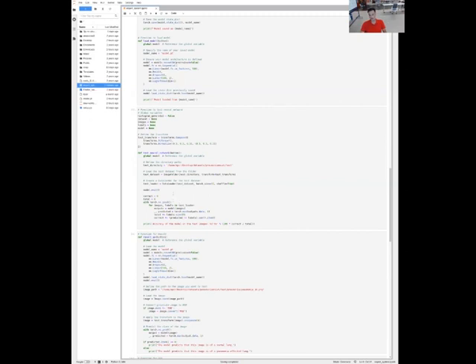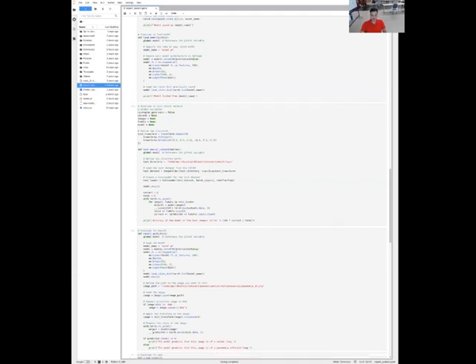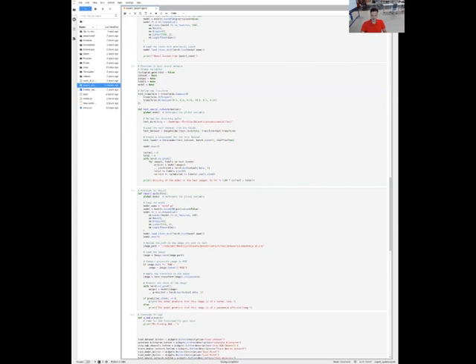Is it 100% accurate, or 90% or 80% or less than that? The percentage accuracy of the model that we train will be shown by this function called test neural network. And finally, we get the result of the pneumonia detection, I mean, whether the particular X-ray image is pneumonia positive or pneumonia negative. It will show you as the result.